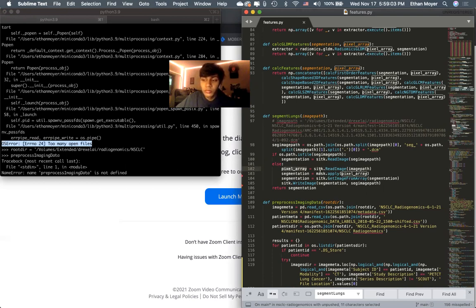I was looking into whether this package has a close function, and I couldn't find one to close the file because I write the image, and I thought that's when it closes the handle to the file opening here, image path.